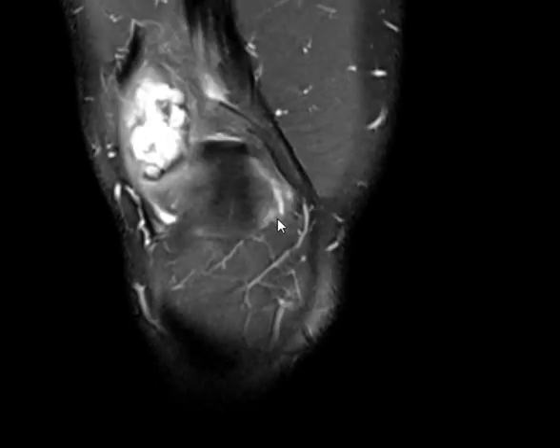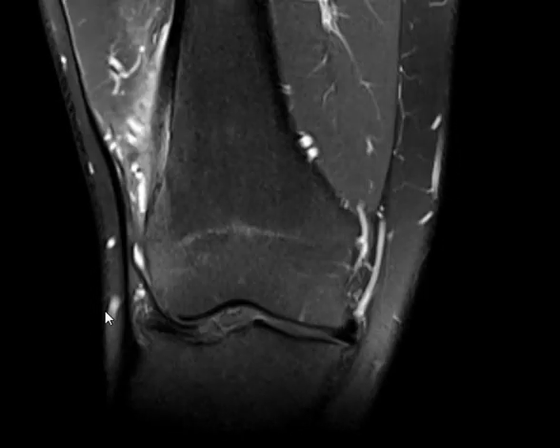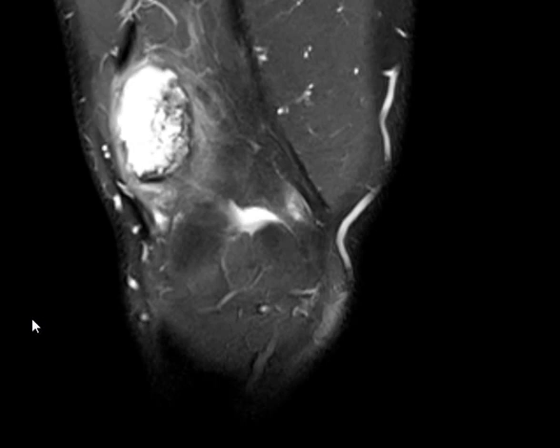First of all, we agreed, as we said a thousand times, when you have a musculoskeletal MRI or CT, first you ask for an X-ray. You didn't ask for an X-ray. That's one against you. I don't have an X-ray, but you should ask. Every musculoskeletal CT or MRI. If you are in a clinic or in a hospital and the patient doesn't have an X-ray, go do an X-ray for him. Don't report it without an X-ray.